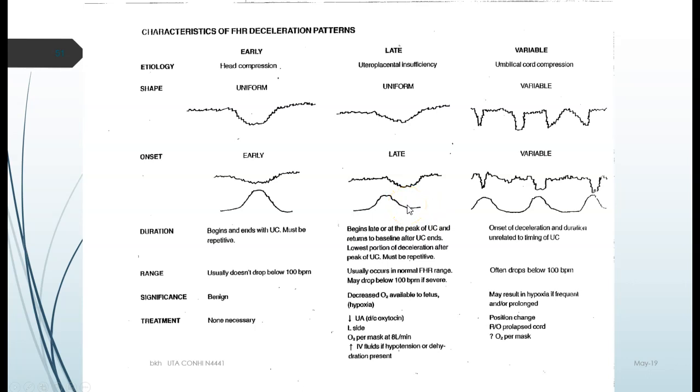And typically, if that was working well earlier, we had a healthy placenta, this insult would not hurt this kiddo, just like this one. These could be the same strength of contraction. But when we have good blood flow, our baby holds his breath during that contraction, no problem. This baby didn't have any reserve to begin with. And so this contraction insults him every time because he can't go that 30, 40 seconds without his oxygen.